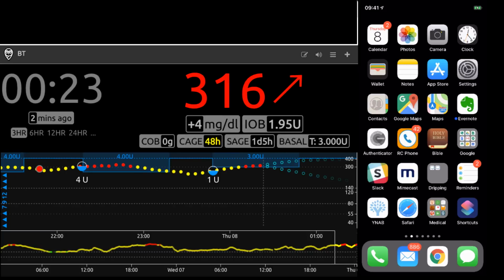Hey everyone, I'm going to give you a quick tutorial on how I'm using iOS Shortcuts in iOS 12 to let my daughter and us do some quick entries into Nightscout. We're on Dexcom G6 and Omnipod, no looping or anything, so bolus entry, basals, carbs, all that stuff is manual entry, and this just makes it super easy.